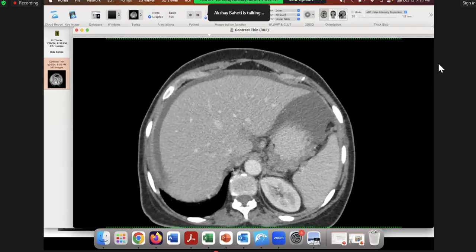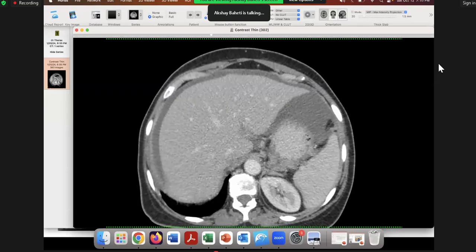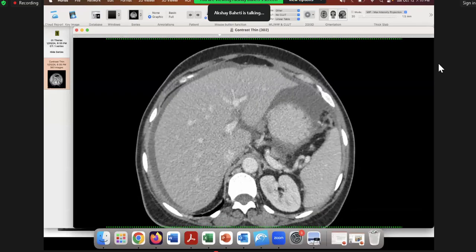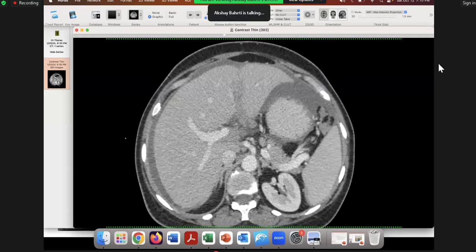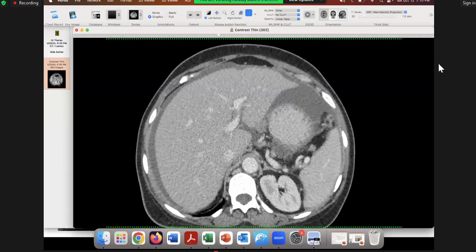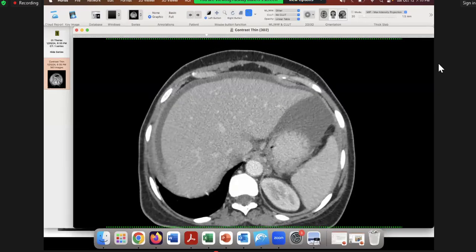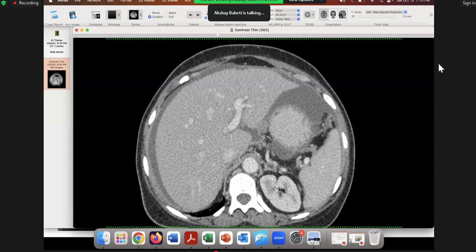Okay, now there's one more nodal group that you will see here, which is a little bigger than usual. So which other group do you see here? I'm scrolling. This is again, I'm still talking of thoracic. So which part of this image is in the thorax or thoracic cavity?